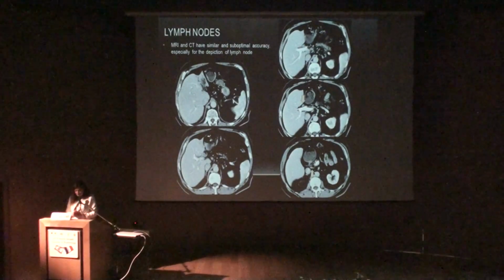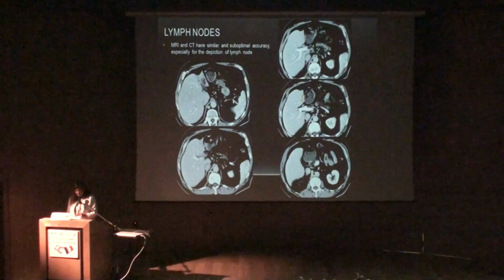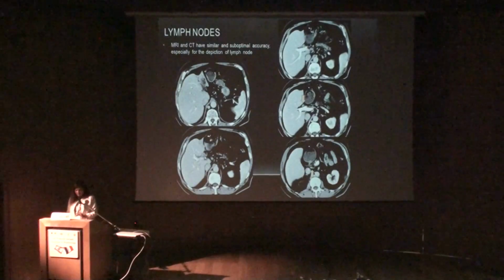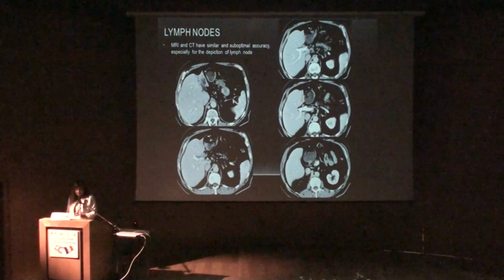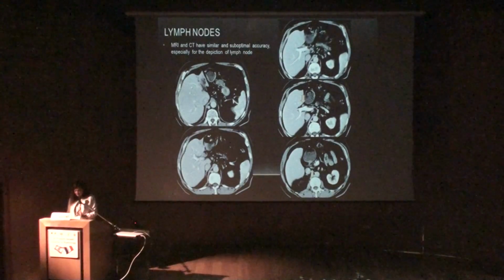I just want to show you this case. You see this patient, bile duct dilatation, you see very nicely the tumor here. Of course, we said in the radiology report that there is a lymph node here and another lymph node here.